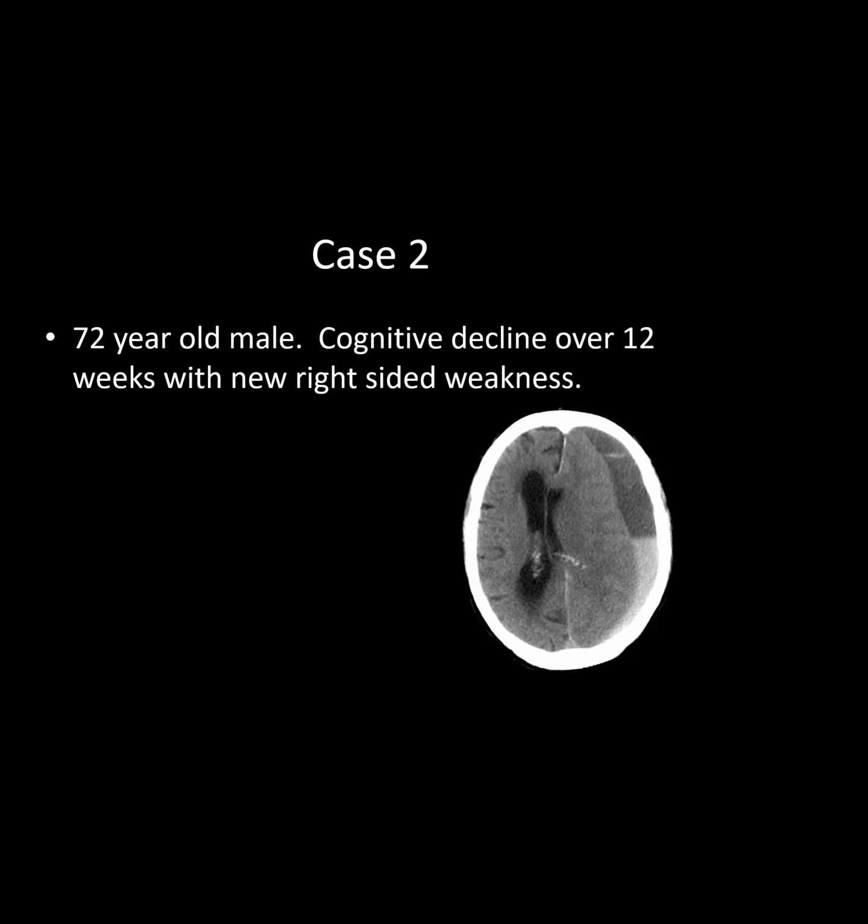Right. How do you know it's a subdural? Just tell me 1 or 2 rules how you know. The shape, it's more like a lens shape. Convex, I'm sorry. I mean, you pretty much said the most important stuff. If it crosses sutures, epidurals don't cross sutures, unless rarely if you have a fracture that crosses a suture, it can do that. But classically, epidurals don't cross sutures. Subdurals do cross sutures and they tend to be more crescentic shaped.